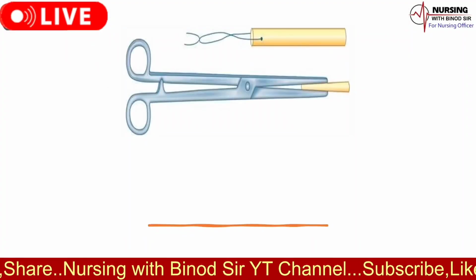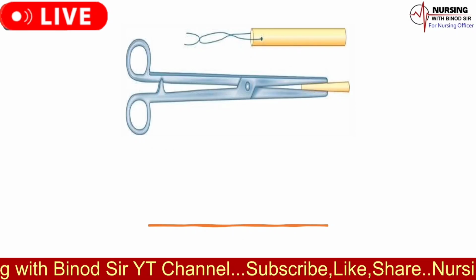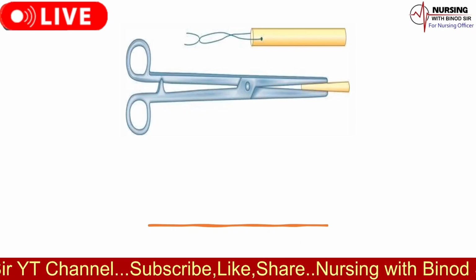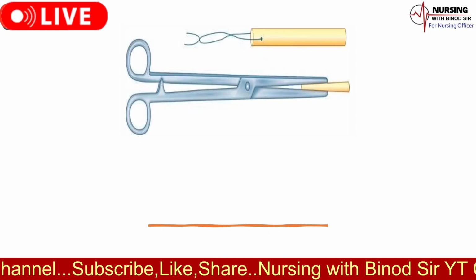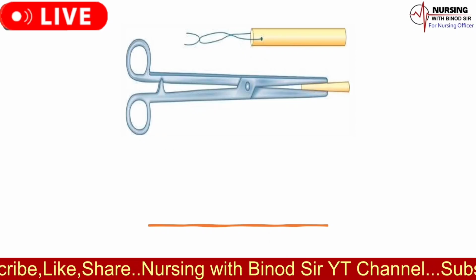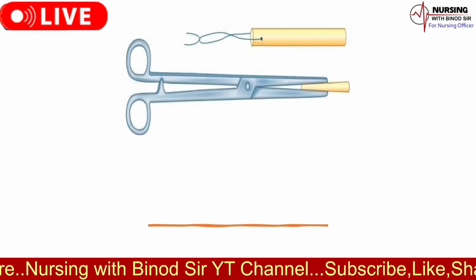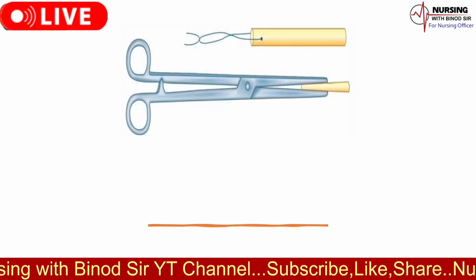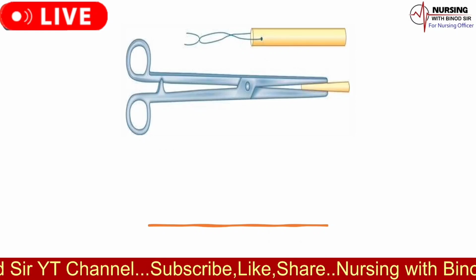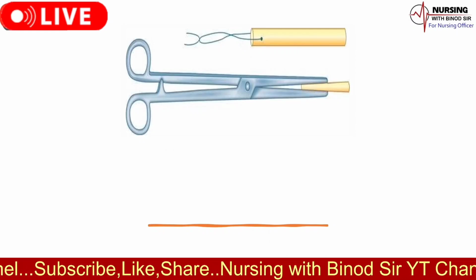The name of the instrument is laminaria tent and the tent-introducing forceps with laminaria tent. The uses of laminaria tent and the tent-introducing forceps with laminaria tent is as follows. Laminaria tent. 1. Cervical dilation. Laminaria tents, derived from seaweed, are used to gradually dilate the cervix by absorbing fluids, which helps it expand. 2. Abortion preparations. They are often inserted a day before surgical abortion procedures to ensure the cervix is dilated for safe and effective procedure.